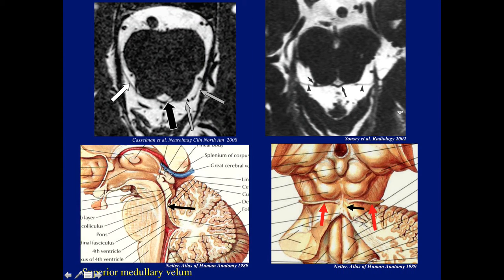However, the Europeans, with their high-quality cranial nerve imaging, demonstrated it very nicely here. We can see at least a portion of the cisternal fourth nerve around the brainstem, both on the axial and again on the coronal plane, traveling laterally here before it turns anteriorly.